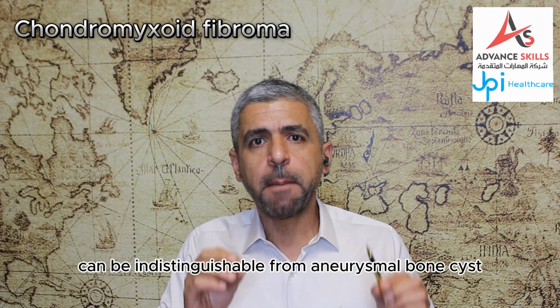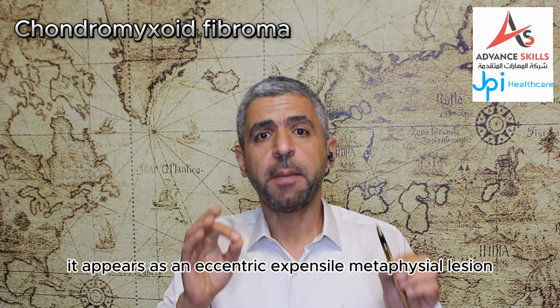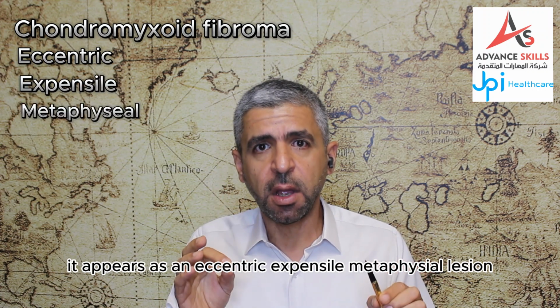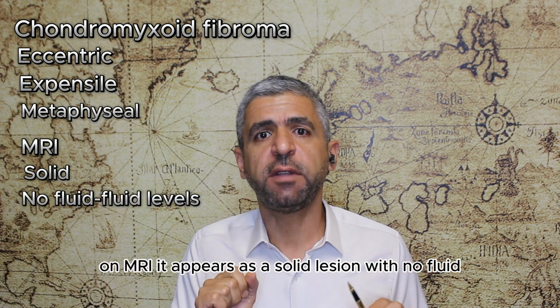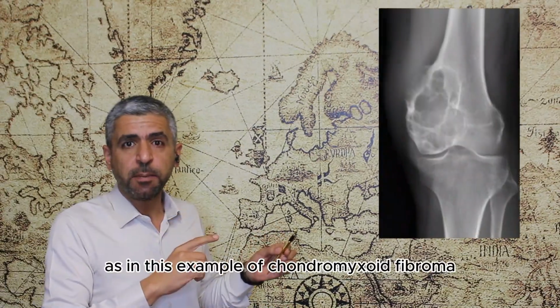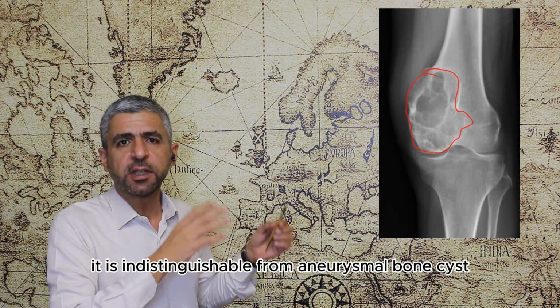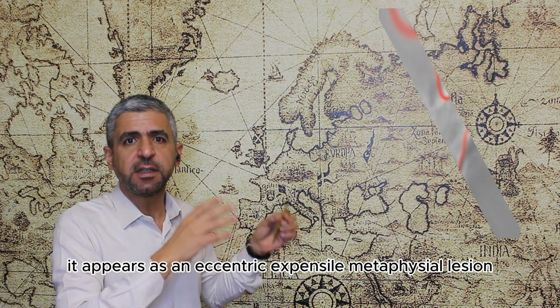Chondromyxoid fibroma can be indistinguishable from aneurysmal bone cyst. It appears as an eccentric expansile metaphyseal lesion. On MRI, it appears as a solid lesion with no fluid levels. As in this example of chondromyxoid fibroma, it is indistinguishable from aneurysmal bone cyst. It appears as an eccentric expansile metaphyseal lesion.